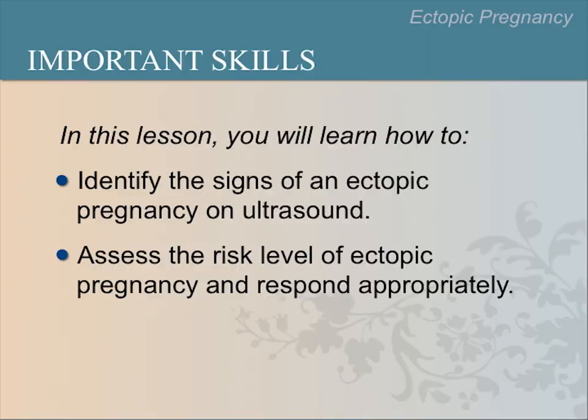In this lesson, you will learn how to identify the signs of an ectopic pregnancy on ultrasound and assess the risk level of ectopic pregnancy to respond appropriately.